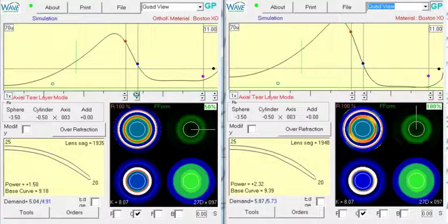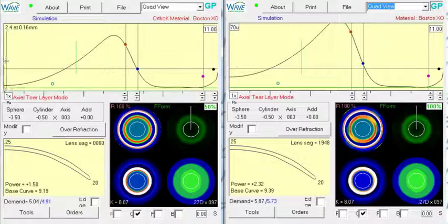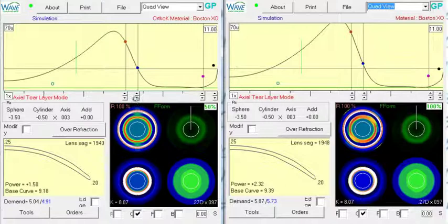1934, excuse me. You'll see that it's mirrored on the other side, and then superiorly, we're starting at about 2.3, pointing at about 10.3 is where we want to be. And we'll let this out a little bit just to make sure we're sealing off at the back edge of the reverse curve. And back off 1.